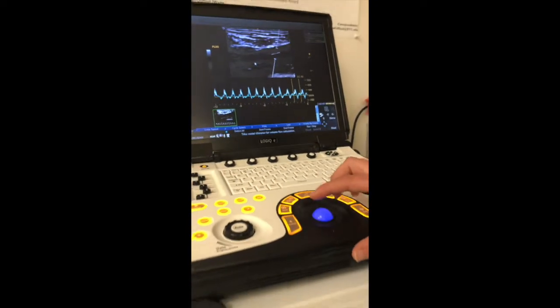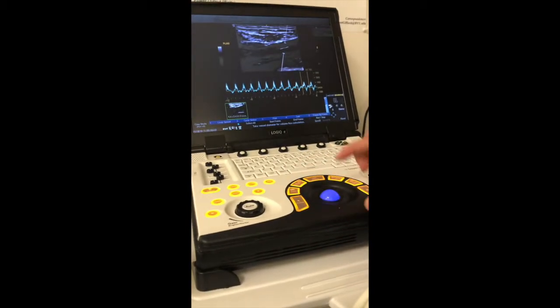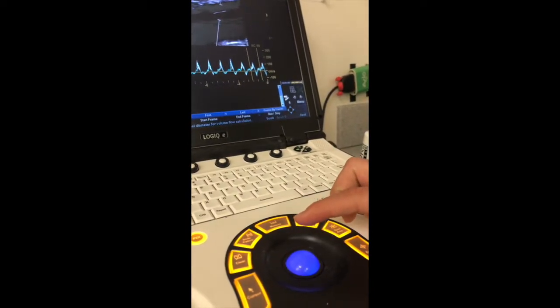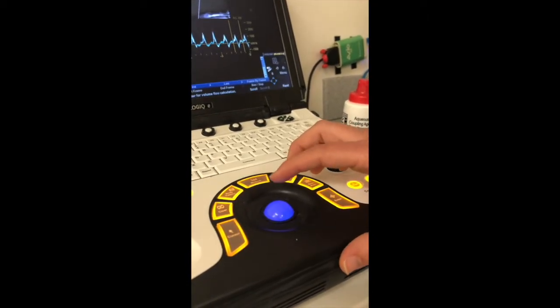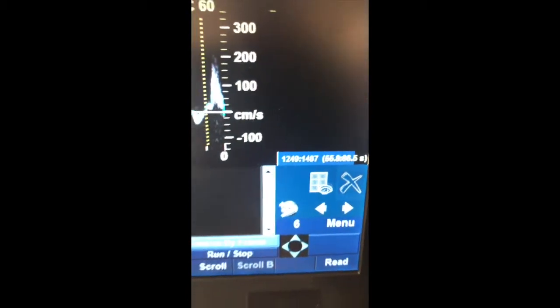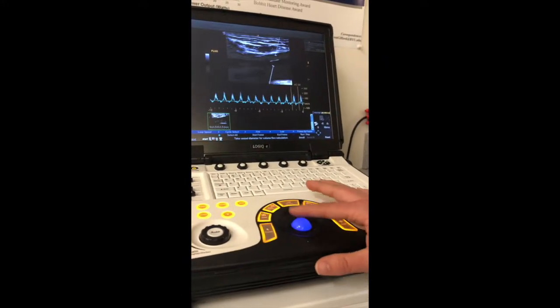I need to click clear for my mouse cursor to go away, which allows me to use this scroller here. So using this scroller, this is really important. With these 1 second averages, we need to start from the beginning of these clips. So any of the PLM that's not baseline, we're going to go all the way down until we get to 17 seconds.